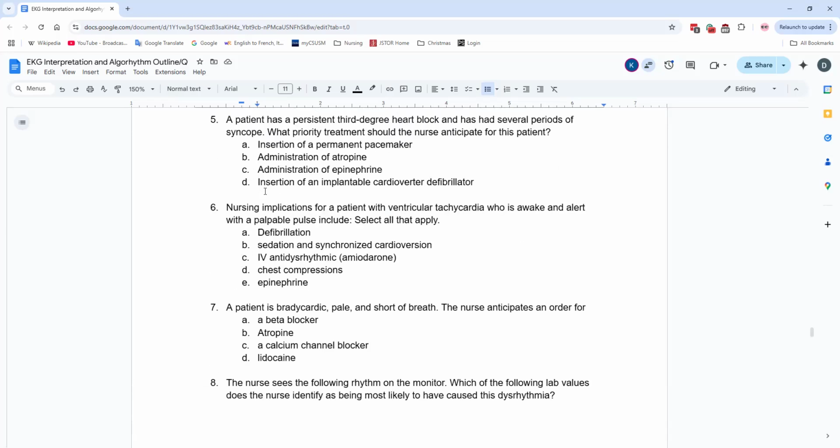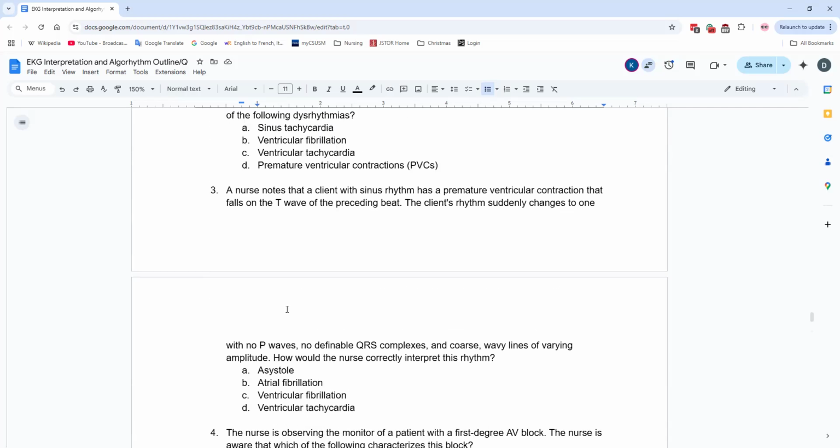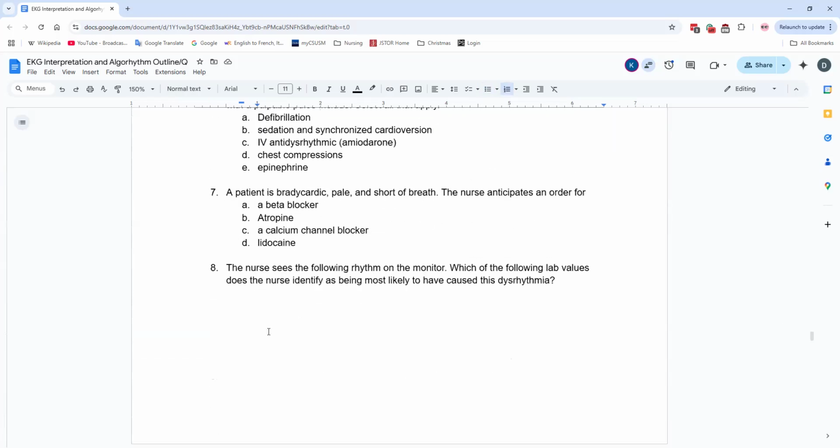Bro, I swear you've had this question before. Let me see. No. Not really, because that one you assess, but well, okay, you just highlighted the answer, so I guess we'll go over it.